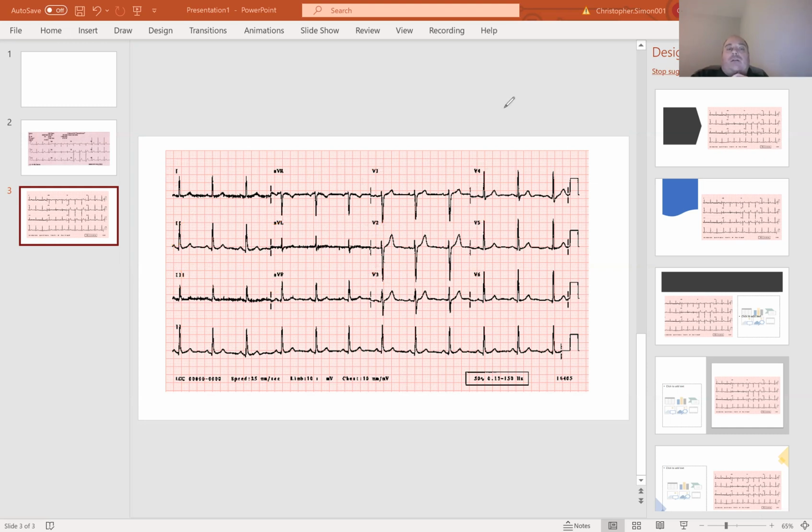So now normally in the previous 12 lead, I would have just probably picked lead 2 and went all the way across. And I realized that this looks a little bit different than this, but that's because the leads are different. It's a different camera angle, and different camera angles are going to look different. And that's okay. It's kind of supposed to be that way. But you'll notice on a hospital-based 12 lead, if you look right here, this is lead 2 all the way across. So a lot of times what the hospital machines will do is give you a 12 lead that has your normal 12 lead.